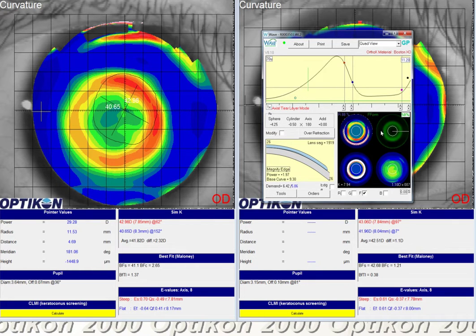We're in freeform mode, actually freeform mode down here. So we'll do the same thing over here. We're starting at 668, so our new target will be 653.